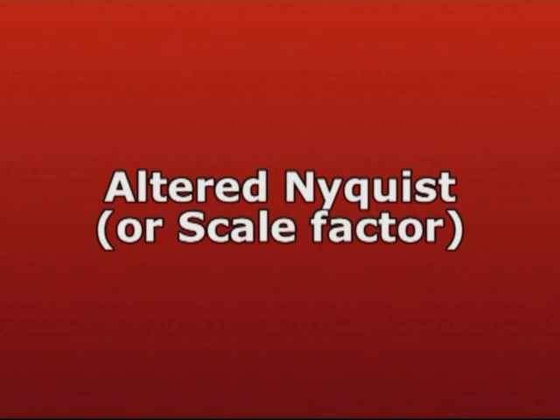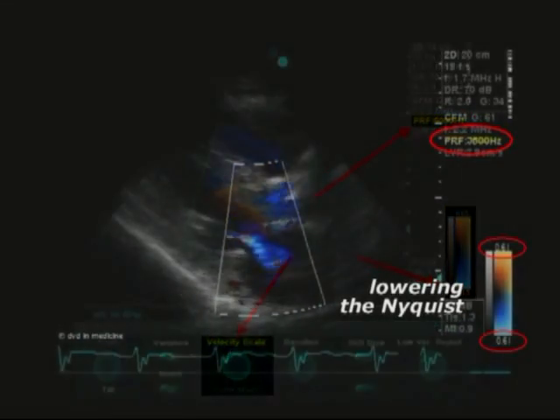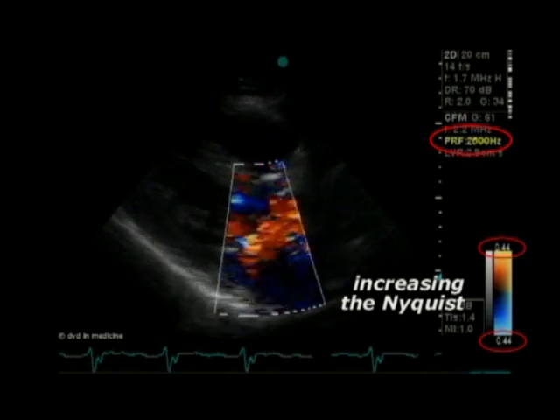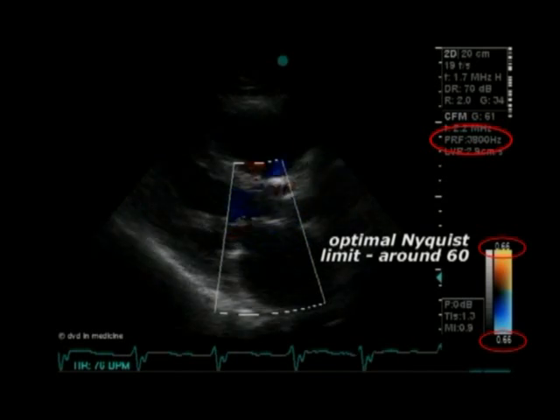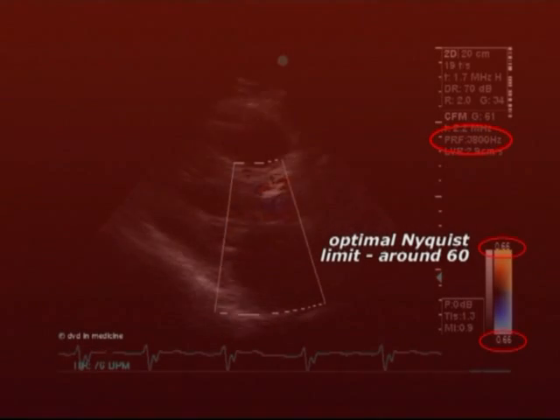Altered Nyquist, or scale factor. Another major factor that can significantly alter the size of the color jet is Nyquist shift. By lowering the Nyquist, or color scale factor, progressively lower velocities will be displayed with increased brightness, artifactually increasing jet size. For the display of color flow images of mitral regurgitation from the apical four-chamber view, most international standards recommend scale factor, or Nyquist settings, in the 60 centimeters per second range.